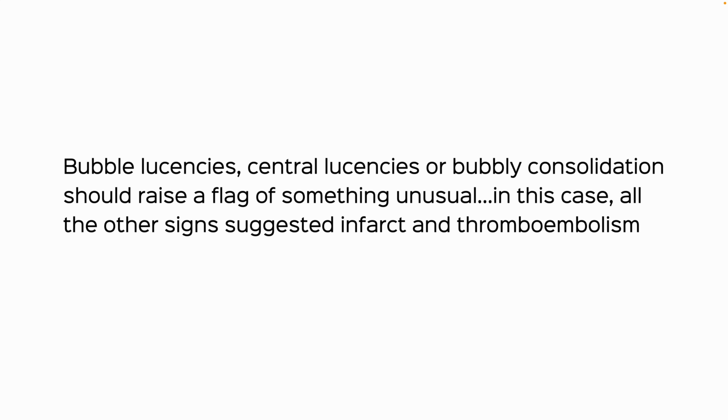infarct. So the message here is that in what looks like a pneumonic consolidation, when we see bubble lucencies or central lucencies or bubbly consolidation, this should raise a flag of something unusual. And in this case, all the other signs suggested infarct and thromboembolism. If you want to read more about this, then case 91 at ctchestreview.com has all of this.